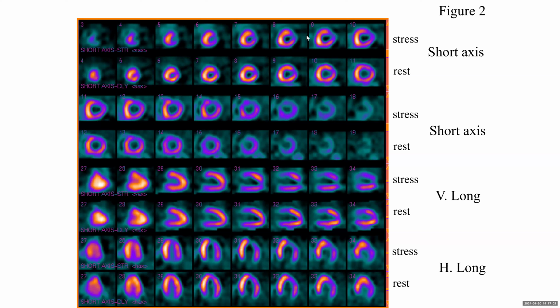You can look at the chat. Some people are actually writing for you. Ejection fraction at rest and with the stress. So there is also a drop of ejection fraction of more than 10%. So people say 10%. Some people say 20%. And the reason is because of the accuracy of assessment of ejection fraction. But anyway, a drop of 10 to 20% is actually considered to be the high risk.